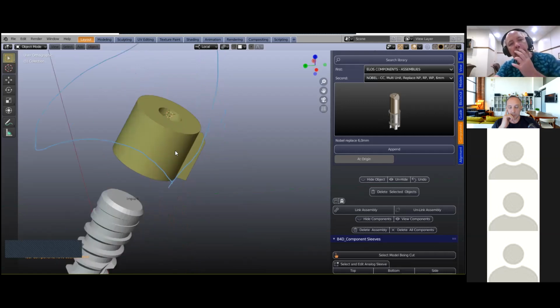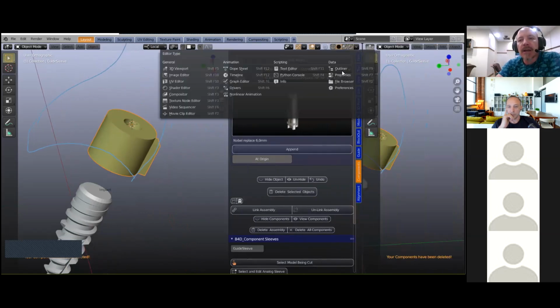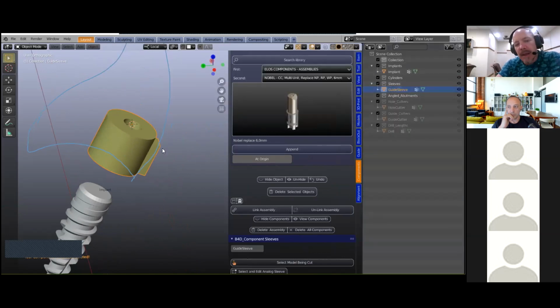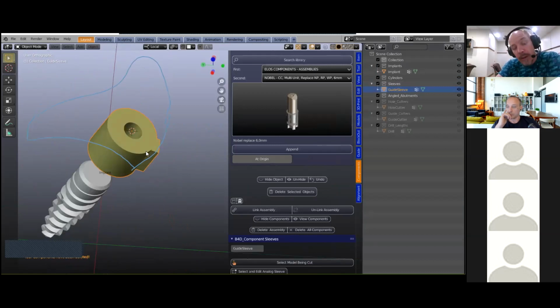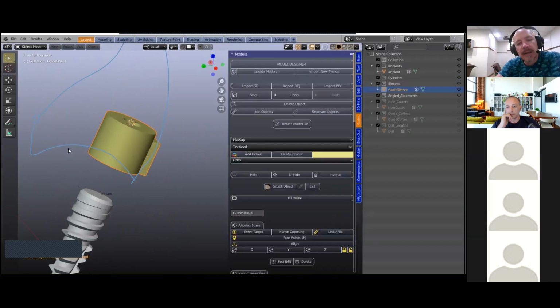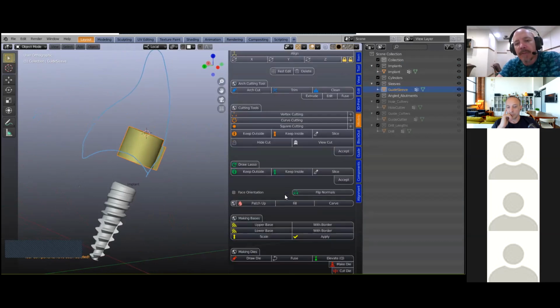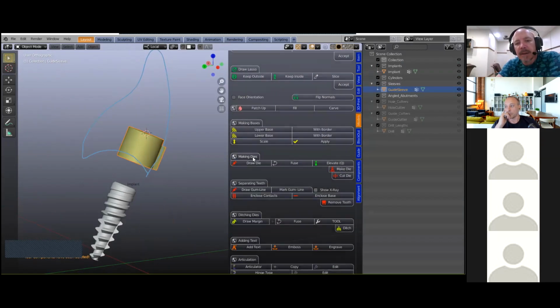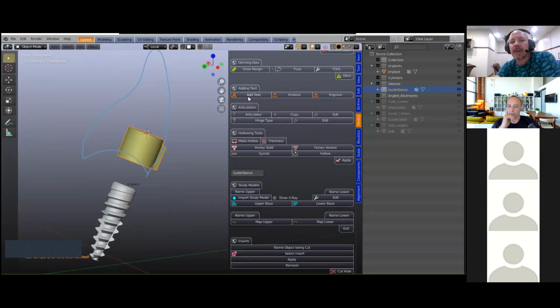So it depends. I would do it right at the end, to be honest, because if you're doing it throughout the procedure in the outliner, there's a lot of things happening here. And if it's a wrong name, as I'm sure lots of us have discovered, it won't work. So I think finish it and then put your name, and just go to the model designer, select your sleeve, and then go to your text. You just look at your text here. Add text.